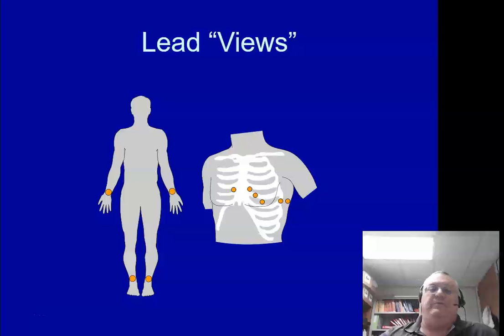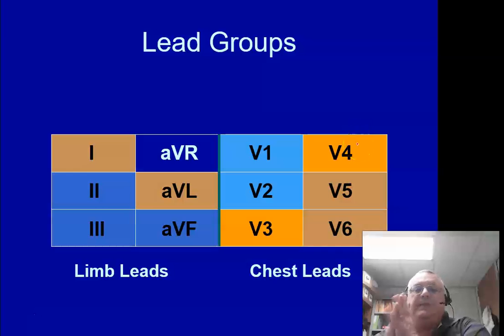All right. Quick reminder of our leads here. Again, this is where you put the leads to get the correct diagnostic look. And this little lovely chart right here. If you haven't already started memorizing this, I would highly recommend that you do so. Again, this is how I'm going to know which are anatomically contiguous leads. Now, one little sidebar on this.